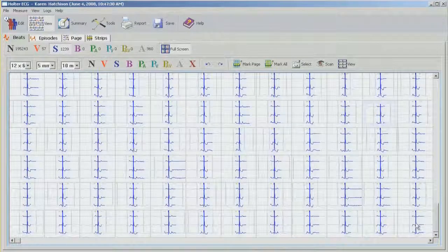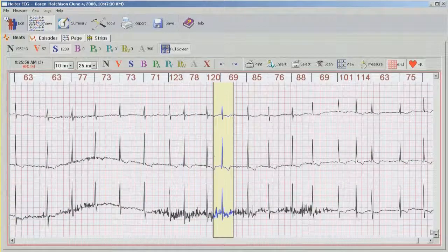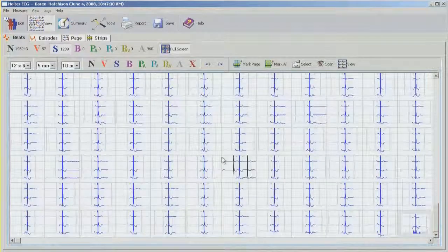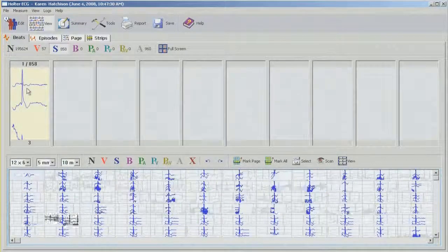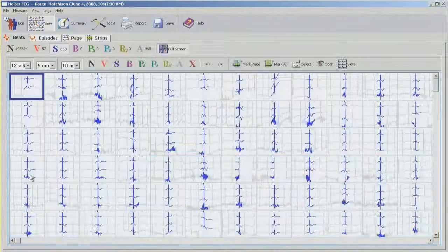And we'll repeat the same move, just double click and drag down all the way to the bottom. So this bin is normal as well. And finally the last bin here.